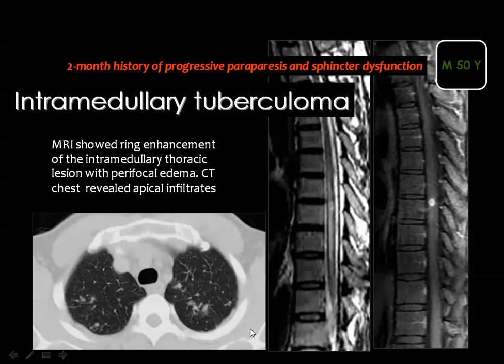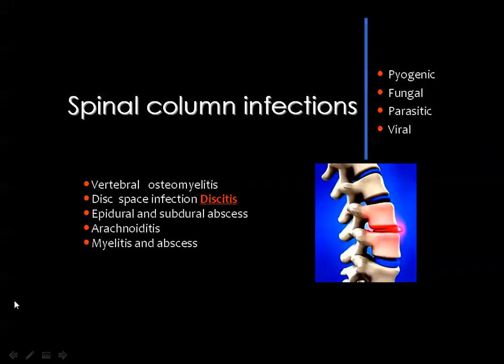Then many times you can also see concomitant TB manifestations in the chest, as you know that these tuberculous infiltrations are commonly seen in the upper lobes, especially in the apical and the posterior segments in the form of strandy nodular opacities. Sometimes you get cavities and calcification, as I have explained in detail in the sector of thoracic imaging.